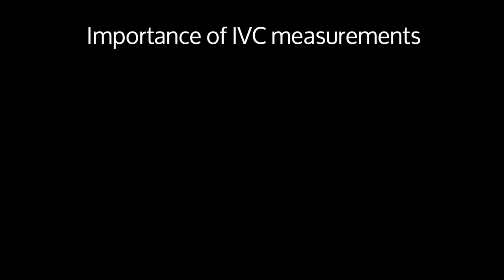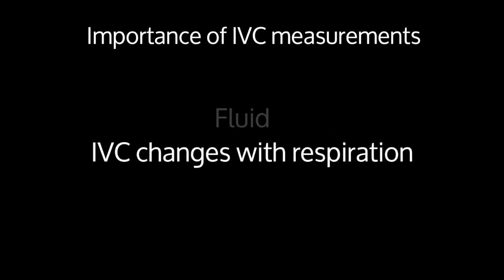Even though we talked about the 4 views of the heart, it would be prudent to also talk about the IVC, as this can help you gather more information that is very important about the patient's fluid status. In a nutshell, IVC measurements are important because they help guide fluid management. The respiratory cycles correlate with changes in IVC diameter in someone that can receive fluid, giving estimates of CVP. During deep inspiration, the diameter gets smaller, and during expiration, the diameter gets larger. We will get into this a little bit more in a few slides, but if the diameter does not change and remains open, remains dilated, this is a suspicion that the patient is pretty overfilled with fluid.